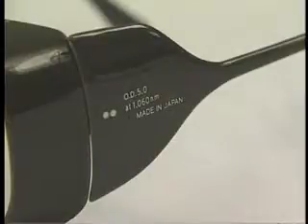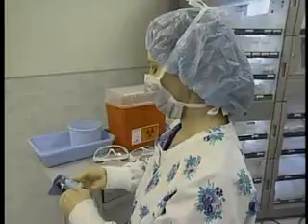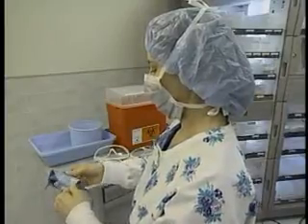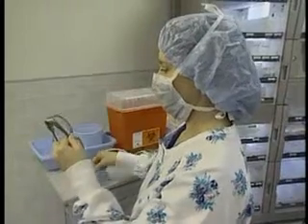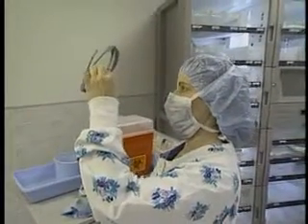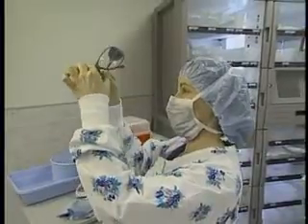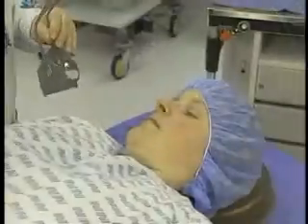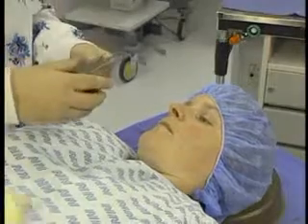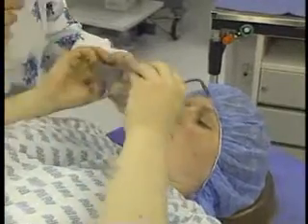The patient's eyes and eyelids should be protected from accidental beam exposure. Keep in mind that patient education equals compliance of the awake patient. Conscious patients can wear the same protection the team is wearing. The sedated or anesthetized patient's eyes should be protected with wet pads taped in place or laser-specific eye shields if the procedure is on or around the eyes.